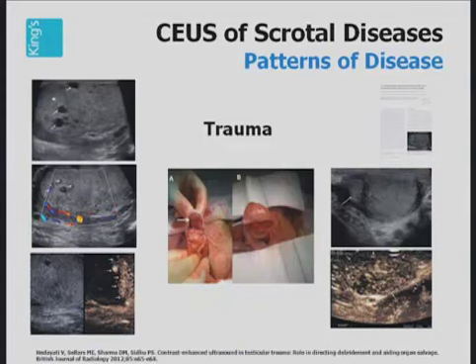Following operation, on the images on the right of this slide, contrast-enhanced ultrasound showed that there was viability in the entire remaining testes. This is a very useful application of contrast-enhanced ultrasound in the testes and should help surgeons delineate the surgical plane.